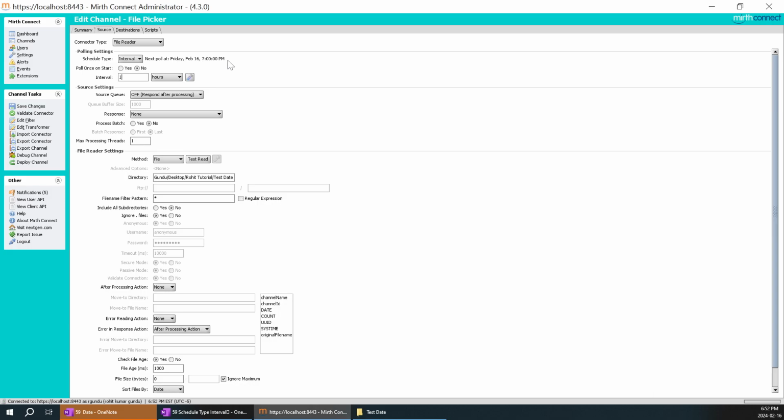While you are doing some change in the production and the client says it should pick up at every 7 p.m., 8 p.m., 9 p.m., when you are doing some simple changes over here, automatically things will change over here. So you should always remember while changing this time. So I'll go ahead and change this back to 5.